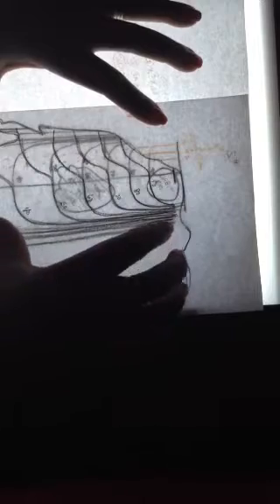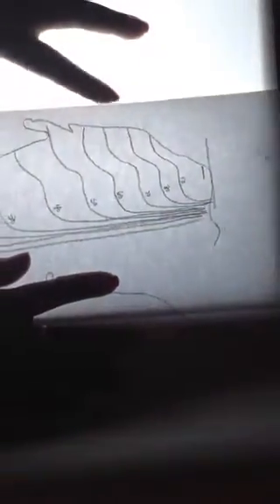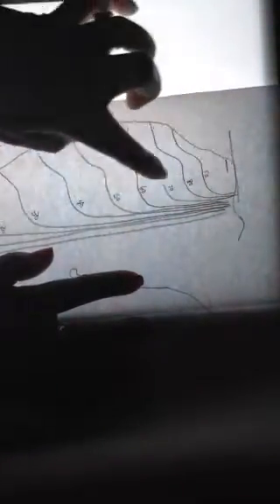So what I did was I just overlaid another sheet of paper, redrew my contour, made new lines to represent the 90, 80, 70, 60, and so forth lines. And this would be a more accurate representation of what the isodose lines would look like through this area of the contour if I put the beam here at the beginning of the tissue.